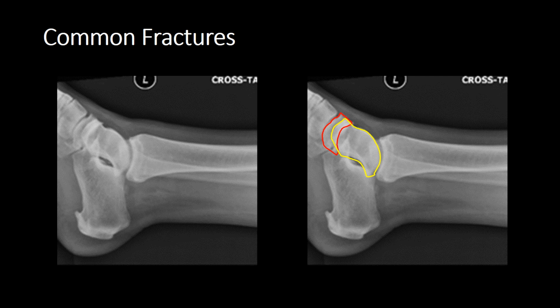And now we can see how it's so easy to overlook this. If you look at our talus, it's completely superimposed over the adjacent navicular. Remember, the navicular and calcaneum have moved laterally, and what's happened now is that it's been superimposed. So we can quite clearly see the navicular and cuneiform joint space is maintained, and so therefore when you perform your image evaluation, always check to see, can you see the full joint spaces? And with this superimposition, you know that there's a dislocation. Had this patient sustained a medial dislocation, it becomes more obvious on the lateral view, because with a medial subtalar dislocation, you actually get the talus projecting anteriorly rather than being superimposed by the navicular.